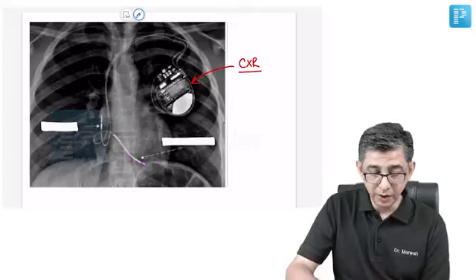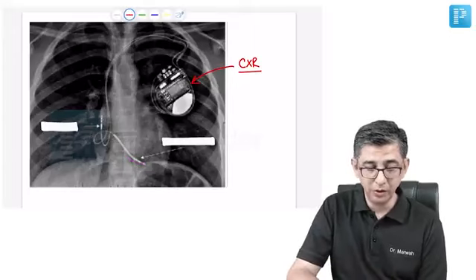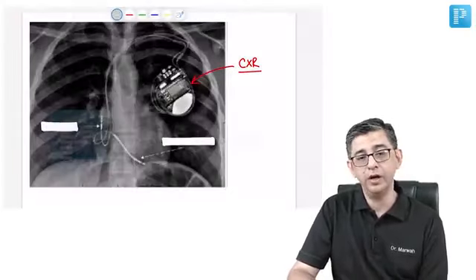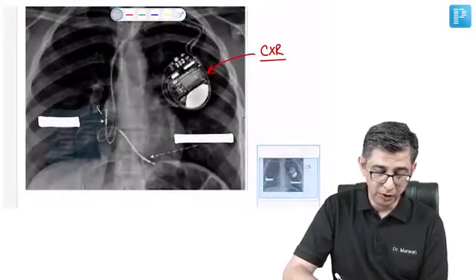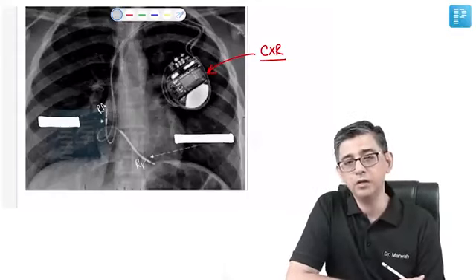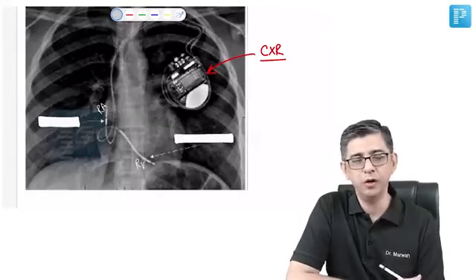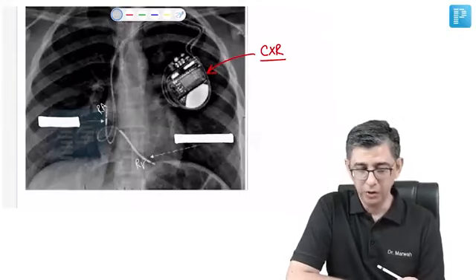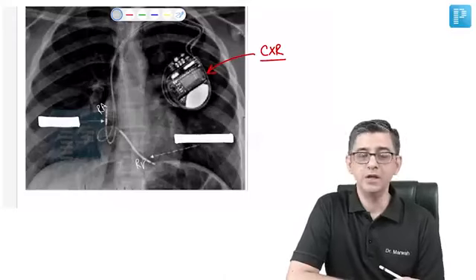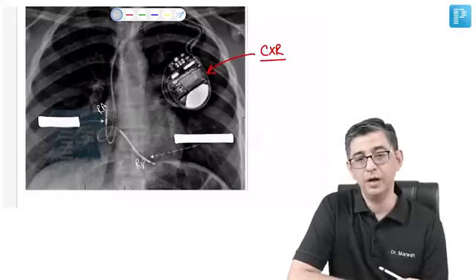This is actually an X-ray, which is surprising because I thought that he will ask theory, and he just shocked everybody by actually asking regarding this pacemaker, which will be sending 2 wires. This is a dual chamber pacemaker or dual lead pacemaker, which is controlling the right atria and the right ventricle. The question said, where is the lead located? So I mentioned the anatomical areas.